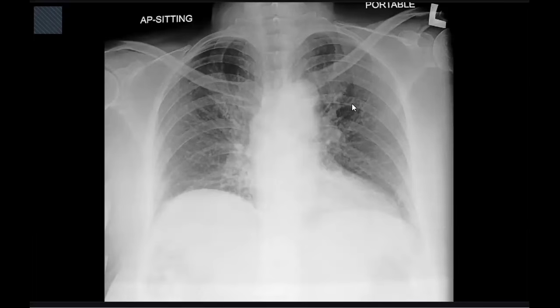Now coming back to the lung abnormalities, I would like to zoom to look for any Kerley B lines. However, with the enlarged hilar and prominent pulmonary vessels... Okay, what are the check areas of plain chest radiograph? Okay, there are apices. I'm looking at bilateral apices. There is mild opacity on the left as compared to right, but no obvious mass lesion is noted. It could be due to the scapular shadow.